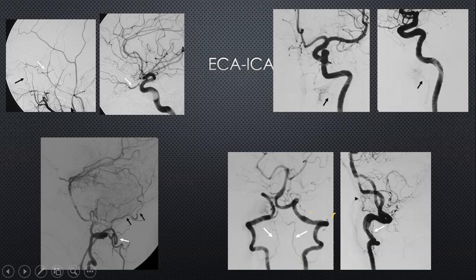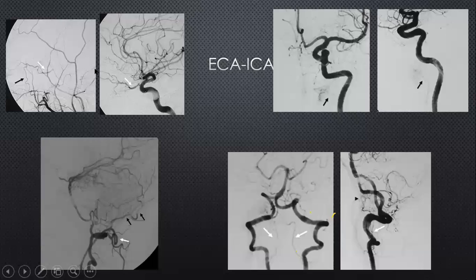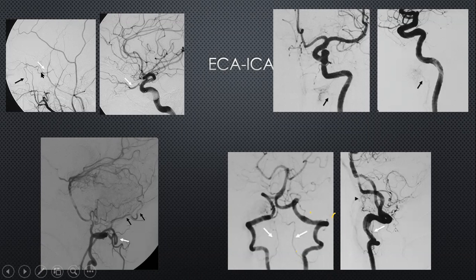For example, here you can see the internal maxillary artery. Here there is no internal carotid artery branch. Internal maxillary is a branch of the external carotid, and you can see how it is forming a collateral flow via the ophthalmic with the internal carotid artery. And this is that same ophthalmic artery over here, and this is the internal carotid artery. So this is a potential anastomotic site.